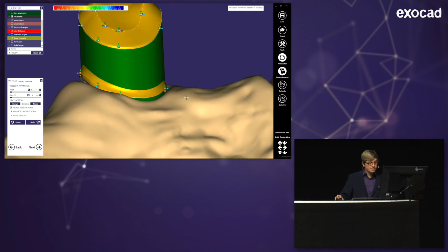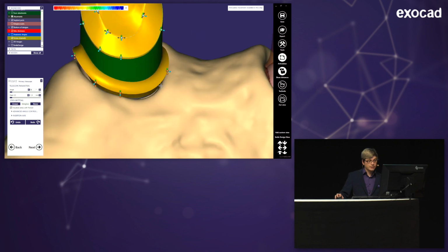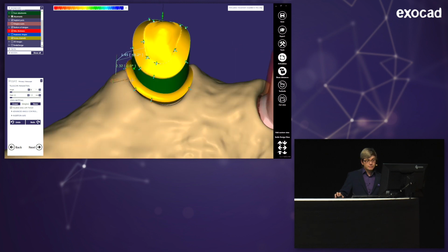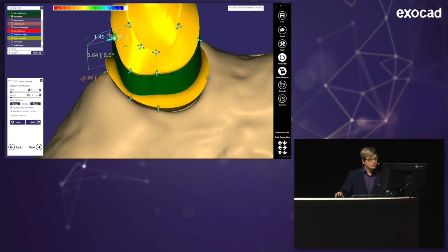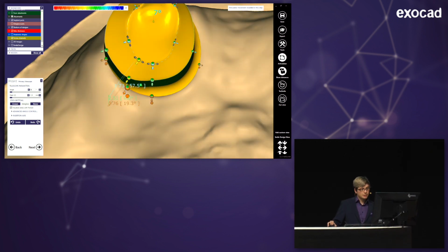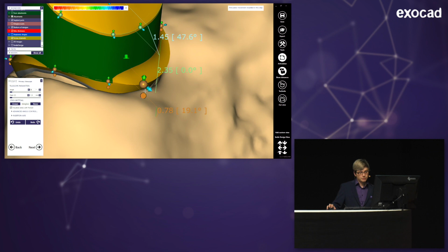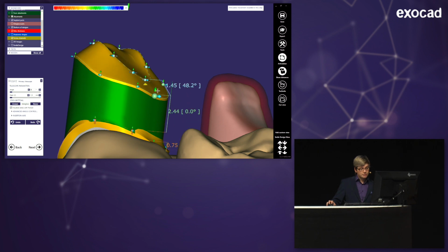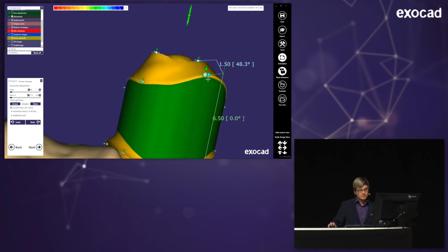But I'm just using the telescopic crowns. And first, I pull out this border down here to secure my gingiva. And here, as always, using control, I can move all the points at the same time. And now, this will actually be the lower shoulder of the milled lingual. Now I'm pulling out some points here, 2 of them actually, to get a bit of a parallel or plane surface here where I can place my attachment in the end. And the lower shoulder will not be here in the end, at this point. So now I'm trying to get all of those points here on approximately the same height. And you may see why later.